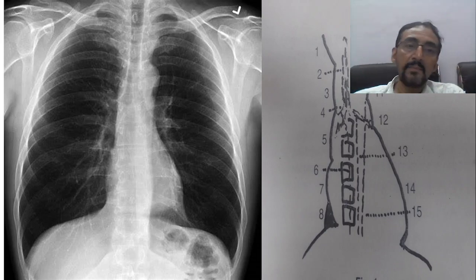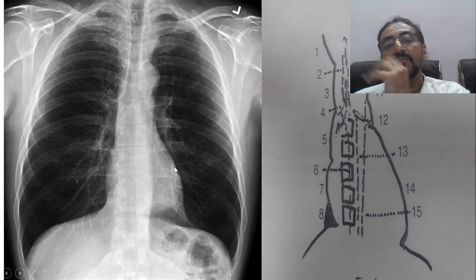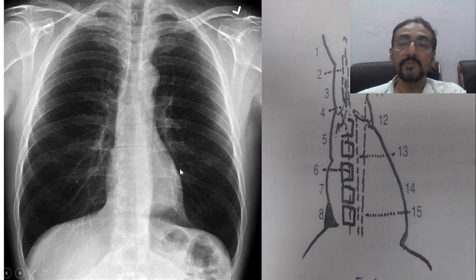राइट साइड में, मिडल साइड्स में क्या क्या स्ट्रक्चर आ रहा है, ये आपका टिप ऑफ द टंग में होना चाहिए. जब भी एक्सरे देखेंगे आप इसी को देखेंगे, तो वहाँ पे कोई प्रॉब्लम है तो उसका मतलब है उस स्ट्रक्चर का प्रॉब्लम है. ओके, सो इफ आई से दिस पर्टिकुलर लाइन, यहाँ पे ये लाइन बहुत ज़्यादा ऐसा आ चुका है, सो देन आई कैन से, दिस इज नथिंग बट एनलार्जमेंट ऑफ द हार्ट. सो ये जो लाइन है, इस लाइन से इस साइड में है तो वो एनलार्जमेंट है. ठीक है, सो दिस इज अ बेसिक थिंग, इसका स्ट्रक्चर हमें पता होना चाहिए.